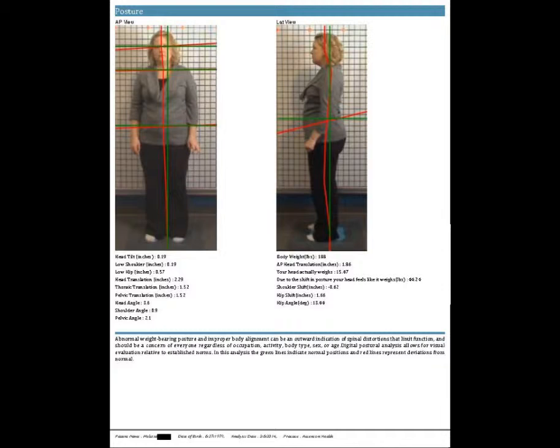So here's how I start on this page. I start by telling the patient the first thing we look at is your posture. And what we do is we draw a line from the center of your feet, and I take my pen and I do this as I'm explaining it. Through the center of the abdomen, through the center of the chest, and through the center of the eyes. And that line should match this weight-bearing line, this green line that goes straight up perpendicularly. And what I tell them is that the green lines are normal and the red lines are where they are.